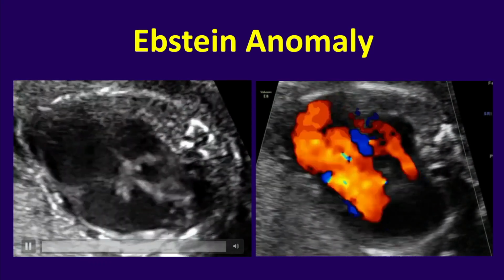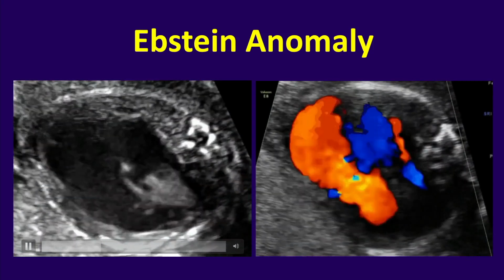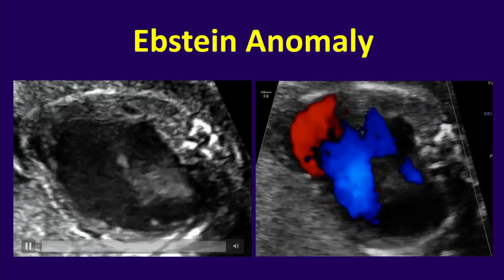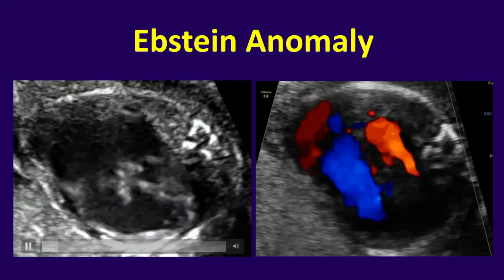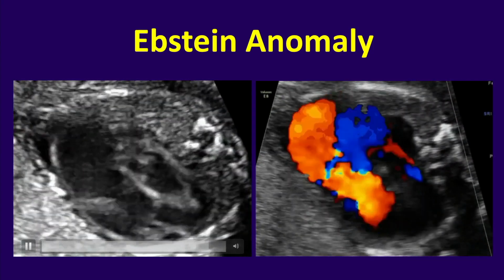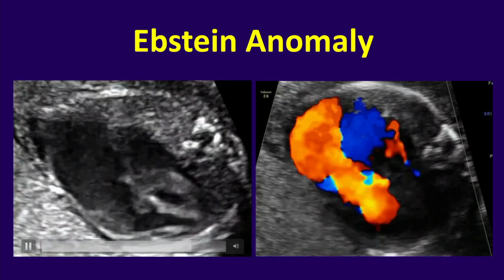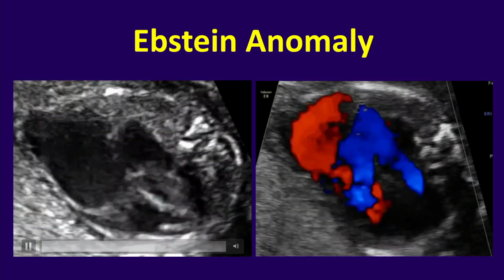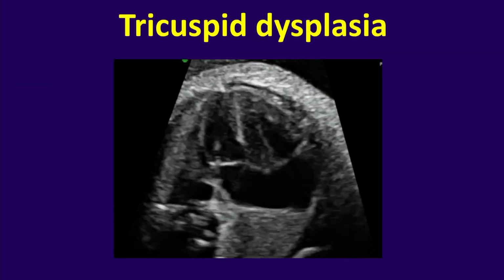That large heart may affect the development of the lung, and you can see how little lung tissue is left here, and this fetus is just 25 weeks. So here we can expect that later on the baby will have a significant compromise of respiratory function after birth, that also will contribute to the poor pregnancy outcome. So this is like the other side of the spectrum.